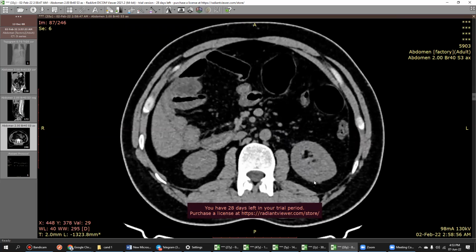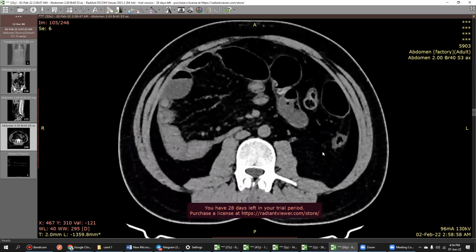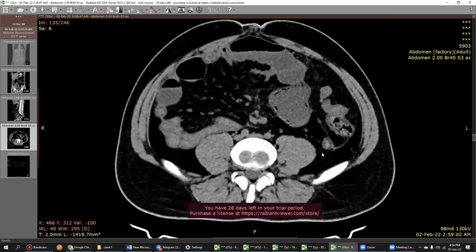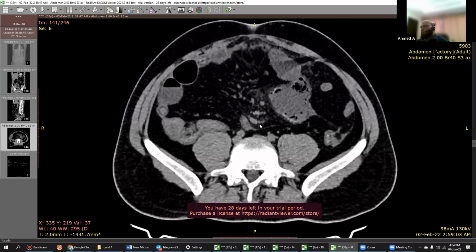Great. So your final diagnosis is? My final diagnosis is ascending colon involvement, which is showing increased dilatation with associated pneumatosis and fat stranding. It can be infection, it can be malignancy, although I don't see any evidence of enlarged lymph nodes.